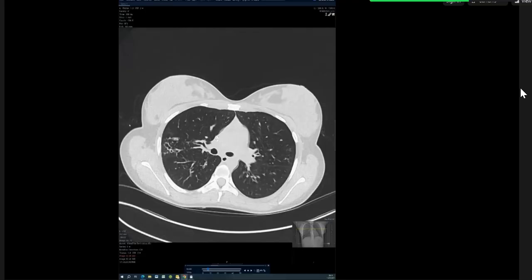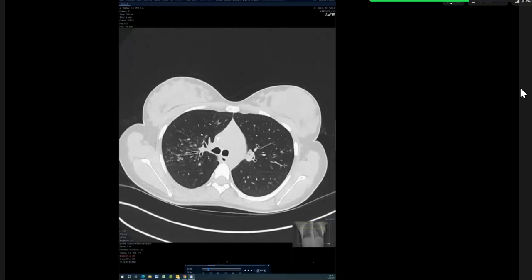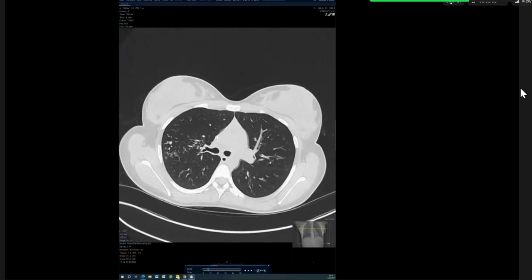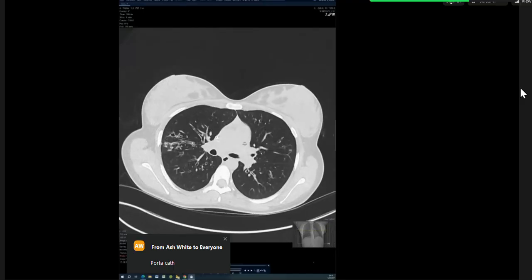What is endobronchial thickening? Endobronchial thickening is... you mean bronchial wall thickening? Bronchial wall thickening, yes. Sorry. And you mentioned traction, bronchial dilatation, and bronchiectasis. Yes. So you have to pick one, I'm afraid. Yes, you're right. I think there's cylindrical and cystic bronchiectasis. Apologies. So when you say traction, you're implying ILD, and the patient doesn't have ILD.